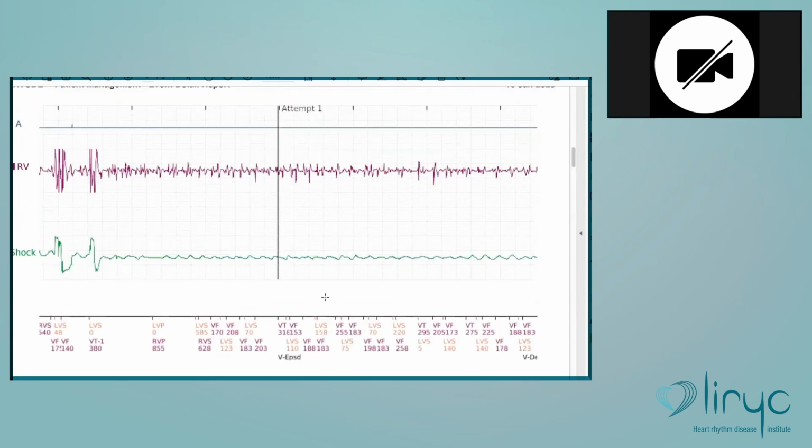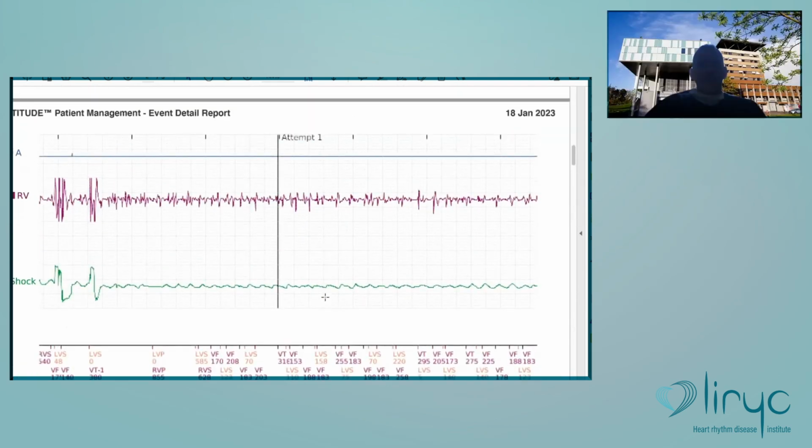Well, this is probably the end of the surgery. Yeah, this is the reperfusion. As I said, I had a look at all the tracings from these centers where there is cardiac surgery, and sometimes they do not deprogram the ICD when the patient undergoes surgery. So you can see quite a low number of these tracings.